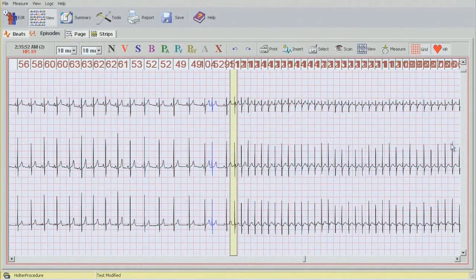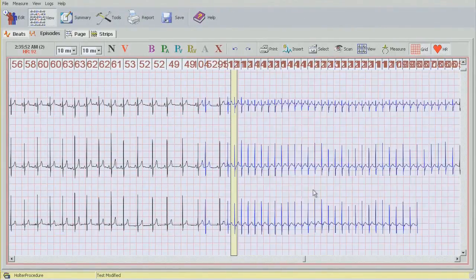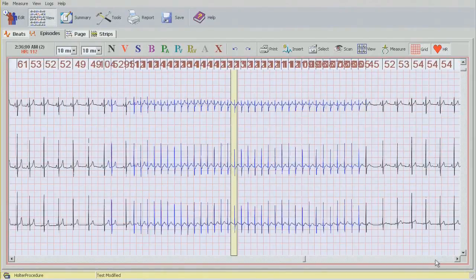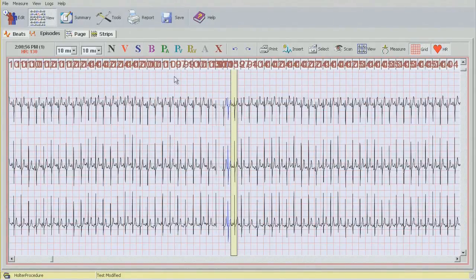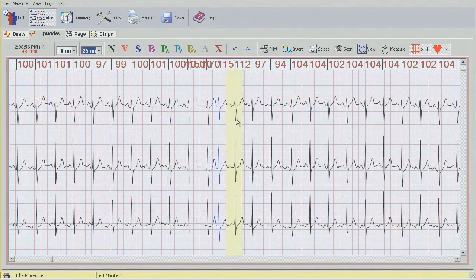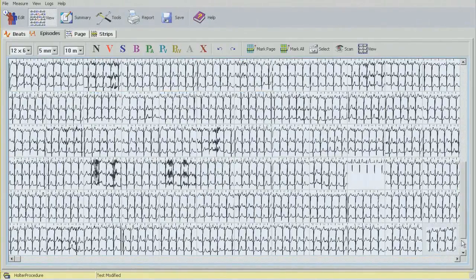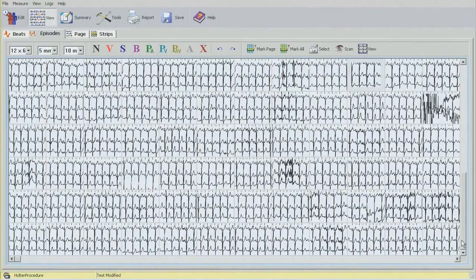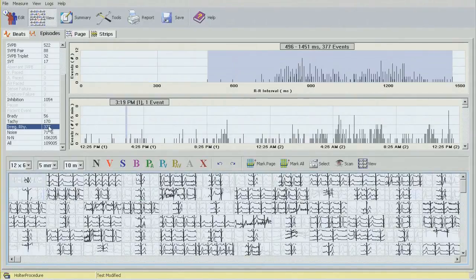So clicking on the first beat and towards the bottom of the end of the page, and changing the designation supraventricular, one last beat as well. Again, go back to your 25 and look through the rest of it, which seems to be correct. So we've added 2 rounds of supraventricular tachycardia. From 15 you went to 17. Now 377 episodes of irregular rhythm.